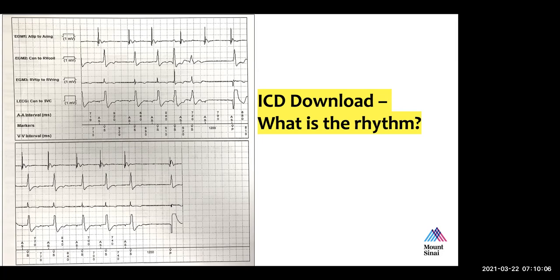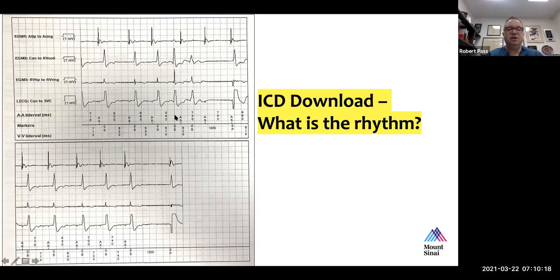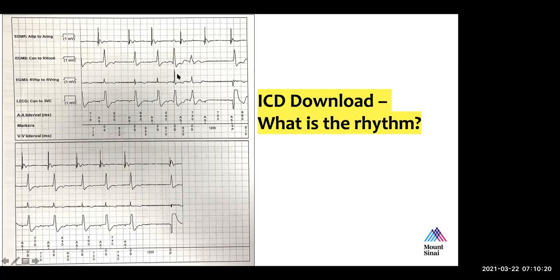Okay. So it looks like initially we are A sensing and V sensing. And then as we progress further, referring to this beat here? Yes. Then there is no A sense, there's only V sense over there. And then again, the A is sensed after the V, and then again there is a V sense.